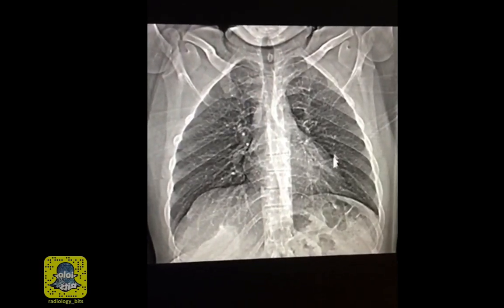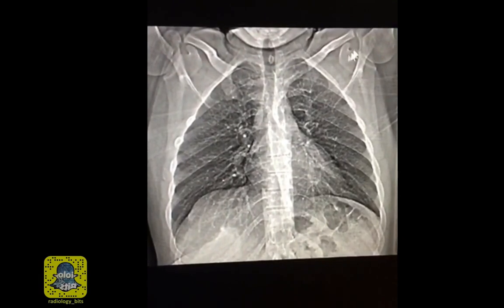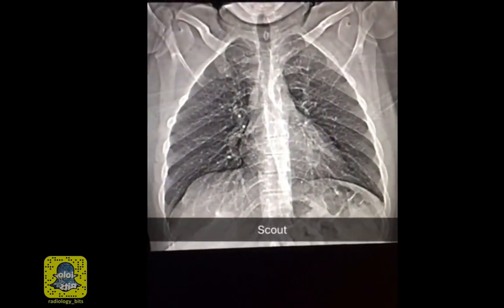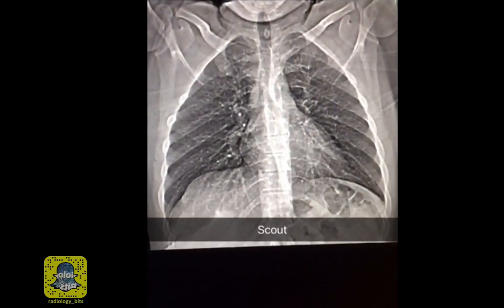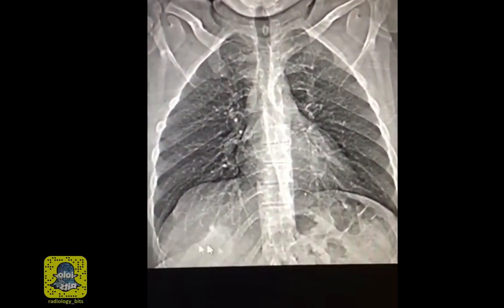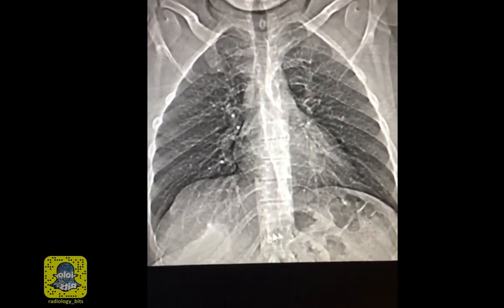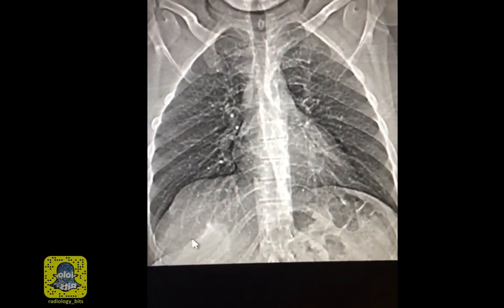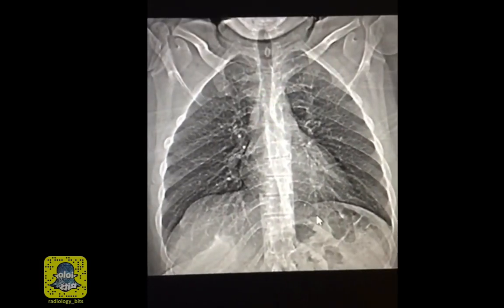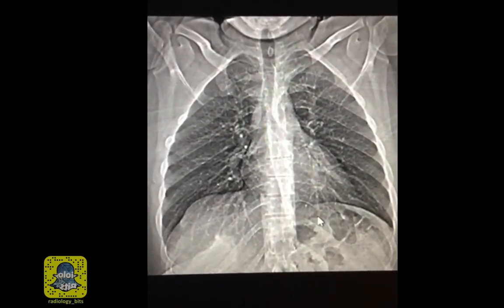When the patient initially lies on the CT scan table in a supine position with his arms lifted upwards, the technician then obtains a poor man's x-ray known as a scout image. This scout image is then used to obtain an optimal field of view when the patient is imaged cross-sectionally. That was a quick explanation to juniors to understand what we're looking at here.